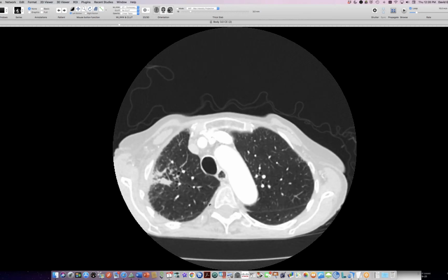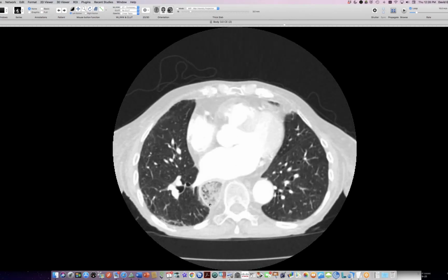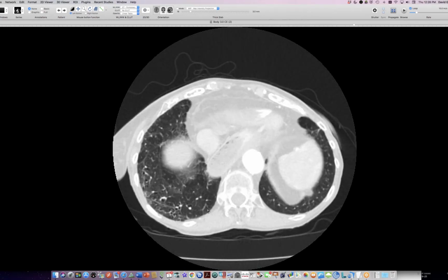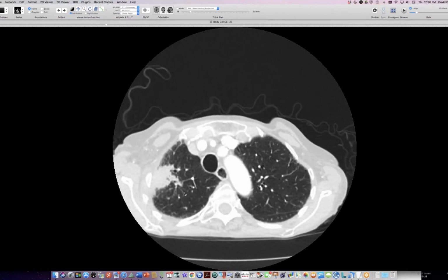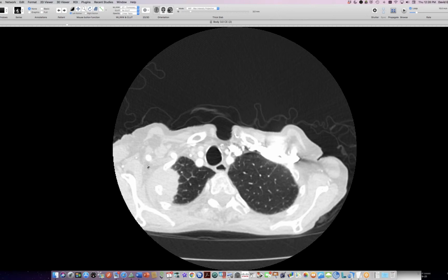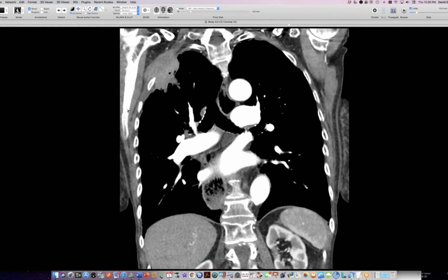She also seems to have a little bit of esophageal dysmotility here, a lot of material in her esophagus and dilation farther down. So this sort of thing would predispose to aspiration, but this is not an aspiration zone lesion here. So Mycobacterium xenopi, I don't think I've ever seen a case of this before, but dramatic lung and chest wall involvement.